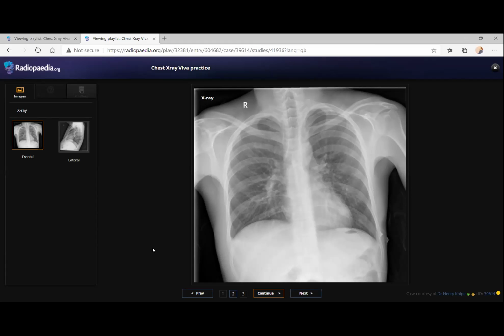I can see they are doing the X-ray for a septic screen. There is slight blunting of the right costophrenic angle, and regarding the thoracic cage as well as the cardiomediastinal shadow, I would like to go through my review areas. Both lung apices are unremarkable.